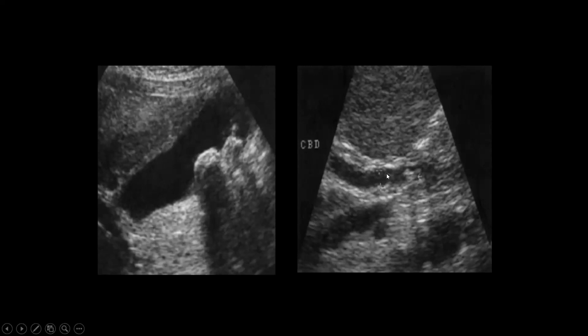This is a sagittal image or longitudinal image of the common bile duct, the CBD, and you can see there's an echogenic structure in the lower CBD, and there's a very thin shadowing posterior to it. So not all shadowing is very clear as with this large stone. Smaller stones can cause small shadowing, which can be very difficult to detect. As you know, ultrasound is operator dependent. It depends on the skills of the sonographer and whoever is scanning. But it is the most sensitive modality for gallbladder stones. And it's widely available. It can be done at the bedside. It's quite inexpensive and is very good for evaluating the gallbladder.